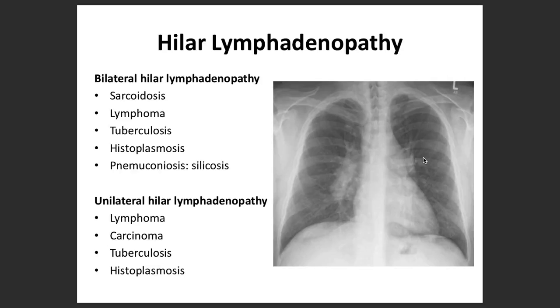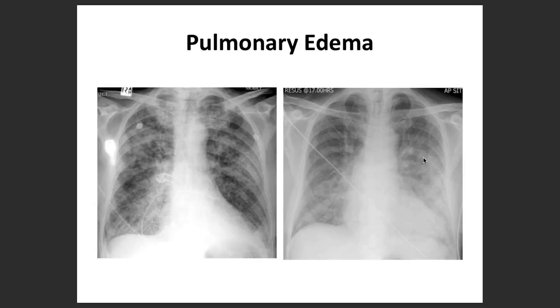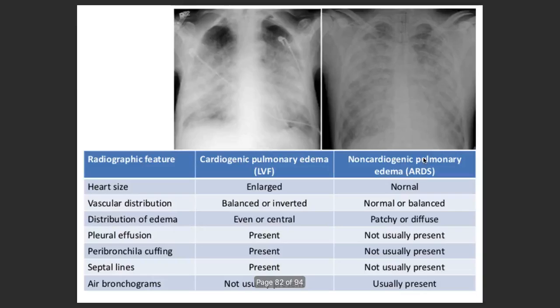Silicosis is an occupational lung disease seen in people working in the silica industry, due to inhalation of silica dust granules into their lungs. So one needs to be slightly more careful. And pulmonary edema, you are all now the masters. You will not be able to forget, right? I've already shown you some examples now.